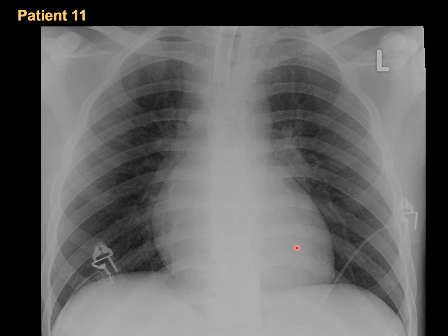Okay, so let's see. A, B, C. The only thing here is I'm not happy with the very sharp edge here and the double edge. A, B, C, D, bones. Okay. E, everything else, nothing. Well, this patient, for me, might be normal, but I'm a little bit suspicious about the right-side hemidiaphragm that is not higher enough than the left side.